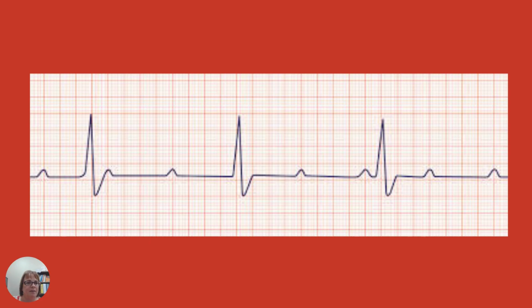Okay, let's look at this one. This one's a QRS. Here's a P wave, and it takes a long time for it to tell those ventricles to fire. P wave, nothing happened. P wave, so this is an AV block, a heart block, because the atria fired and the ventricles never got that message. Remember I talked about the construction, where that road's closed and you have to find all these back roads trying to get to those ventricles to get them to contract.